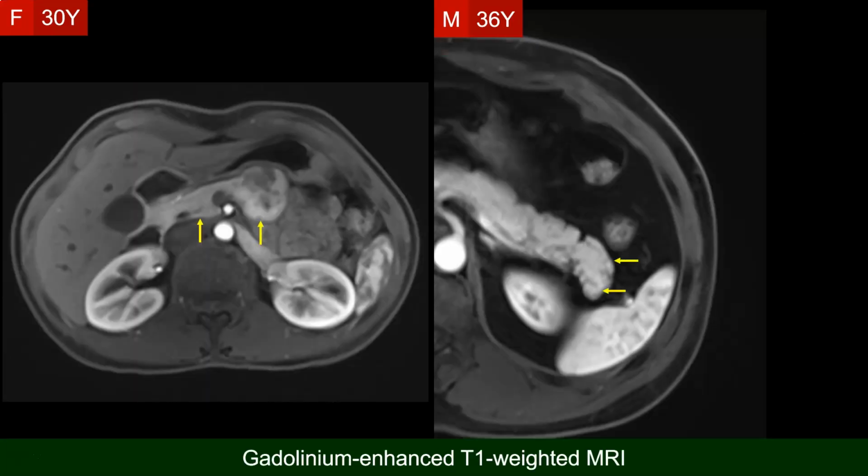Why then is the enhancement of these two lesions relatively less in MRI than CT, although it is known that MRI is more sensitive to its contrast agent, gadolinium, than CT is to its contrast agent, iodine? And although it is frequently said that the distribution of the two types of contrast agents in the intravascular and interstitial spaces is similar, here there are two factors.